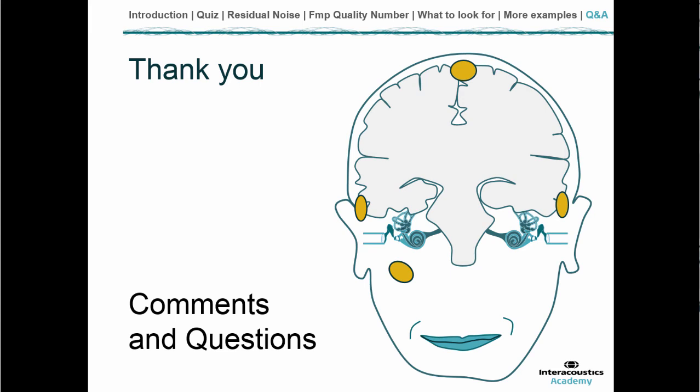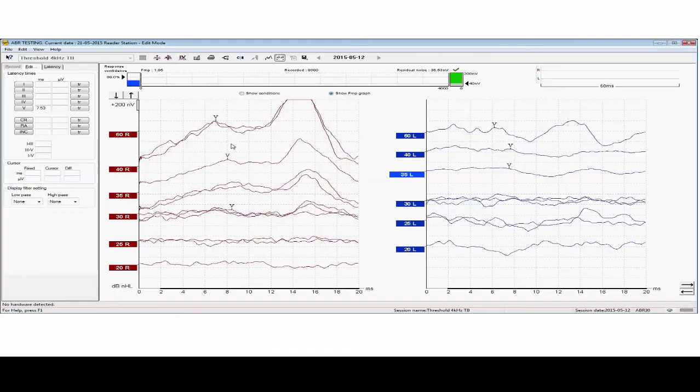And coincidentally, if I move back to sharing my recording from the software, I'm making sure that you can see the software again, because there was a recording with the PAM on it. For those who don't know exactly what a PAM is, the PAM is the label for a very high peak in the measurement that appears after peak number 5 and which results from neck tension. These types of neck tensions and these PAM recordings can only appear if the patient can hear the presented sound. So having this effect in your measurement is a proof of hearing the sound.